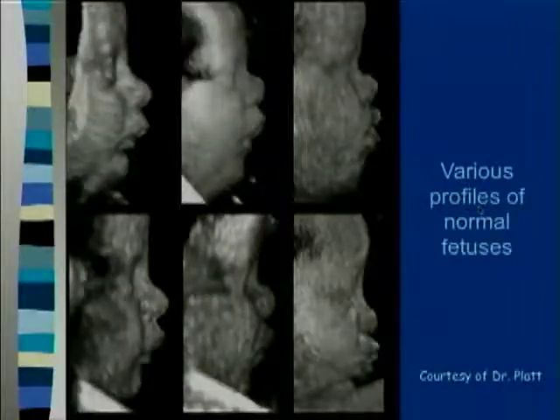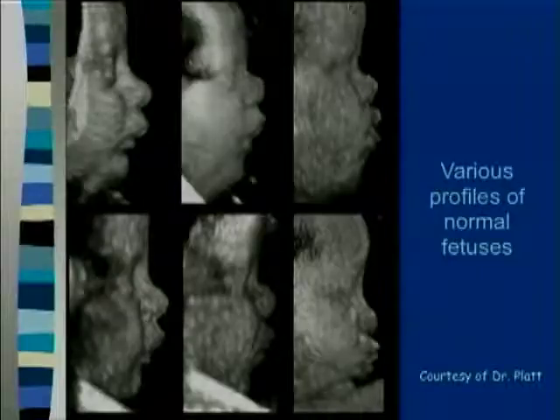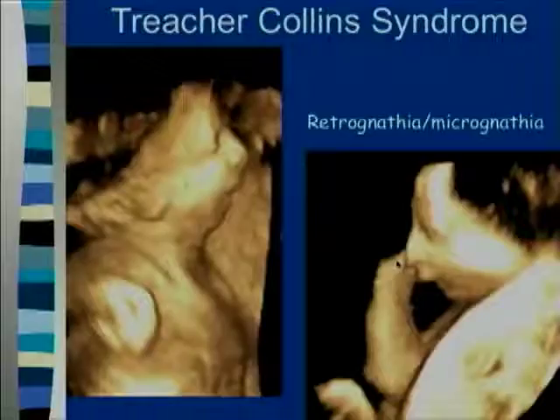And these are just a few pictures, courtesy of Dr. Platt, of nice normal profiles. I just like them because you can just imagine, you know, your uncle looking like this, or this, or this, and they just all are a little bit different.